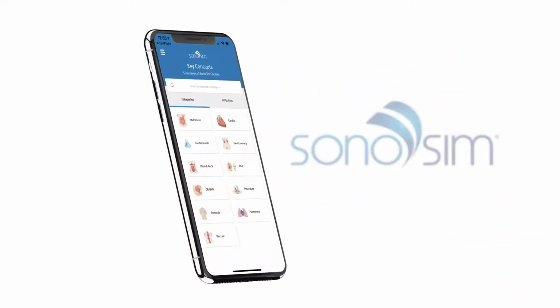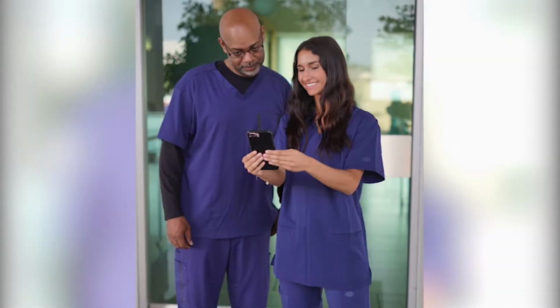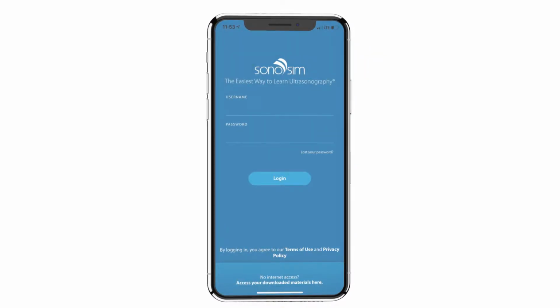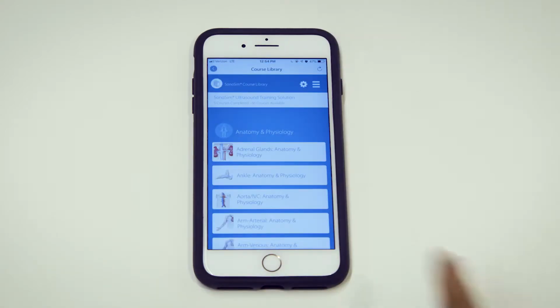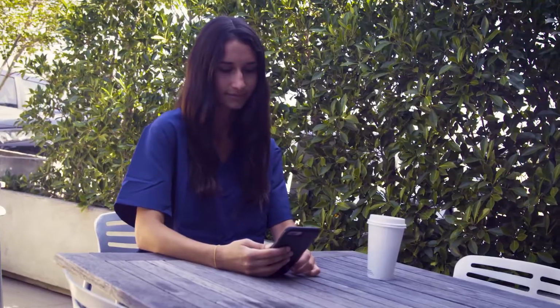The SonoSim app serves as an ultrasound assistant in your pocket and includes new features for our current members. To get started, download the app and log in with your SonoSim username and password. For SonoSim Courses, click on the course library icon, select the desired course, and complete your ultrasound training on the go.